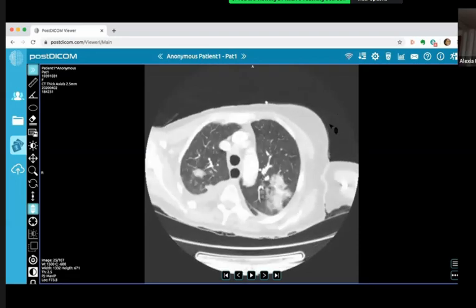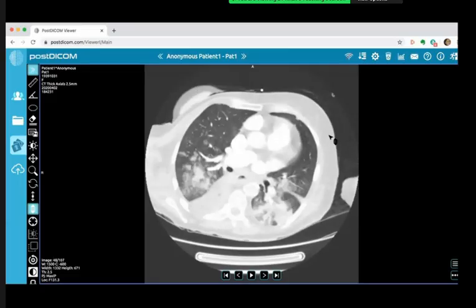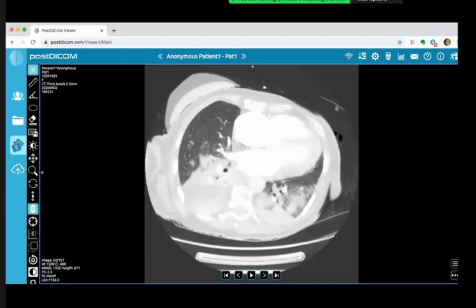Yes. She's still in recovery. And she has a low blood pressure, in hypovolemic shock. So maybe there is a complication in the femoral region, and maybe probably here pulmonary hemorrhage, maybe due to anticoagulation.